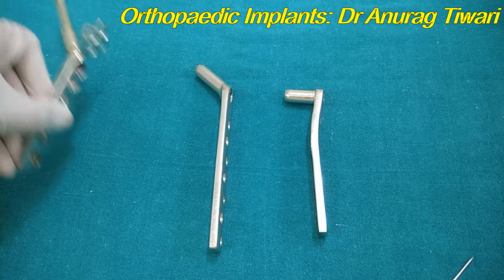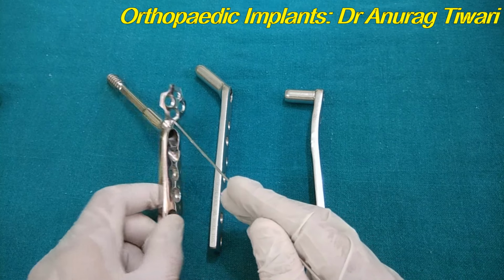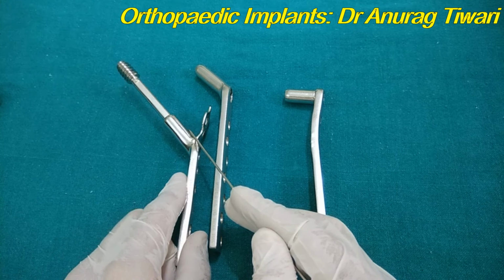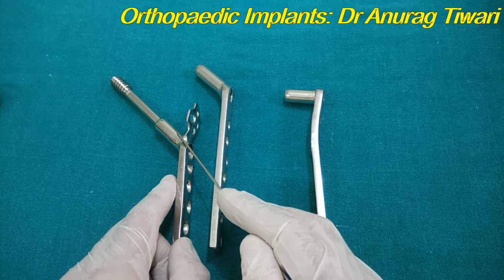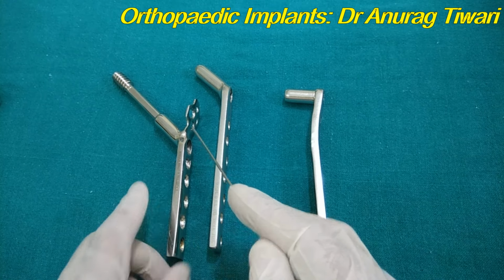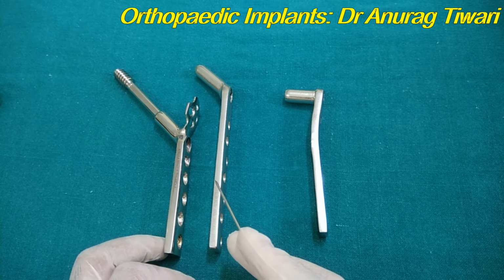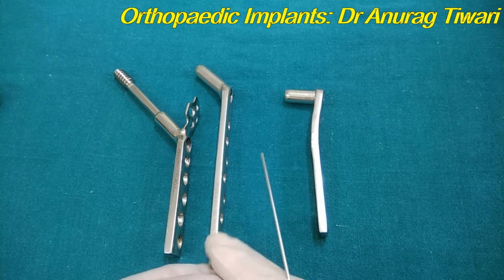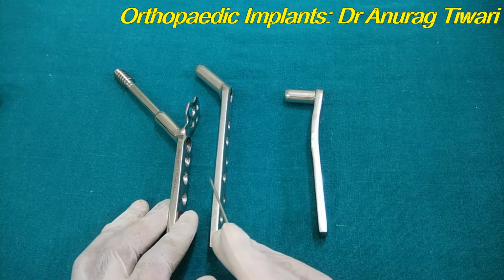Another plate which I want to have a look at is this. It is the same as DHS, however it has an extension of the plate over the greater trochanter. So this is actually a trochanter stabilizing plate. The indication is where you have comminution in the greater trochanter or the lateral wall of the greater trochanter, then you use this trochanteric stabilizing plate. However, this is now not being used. It is going out of favor, mainly because of the PFN. Now the implant of choice for unstable intertrochanteric fractures, for lateral wall comminution or for greater trochanter comminution, is the proximal femoral nail.